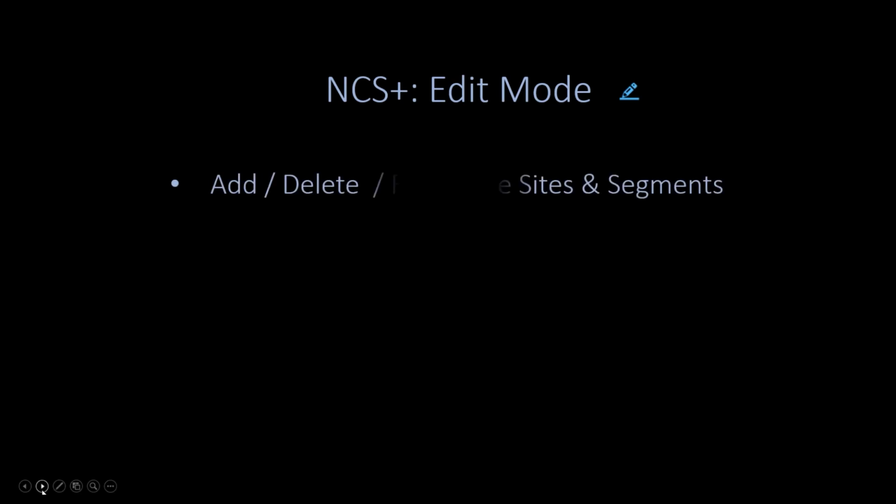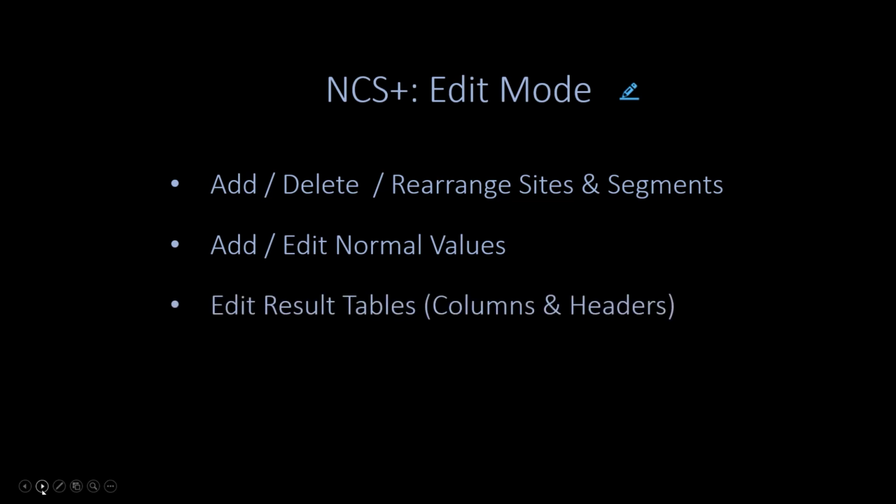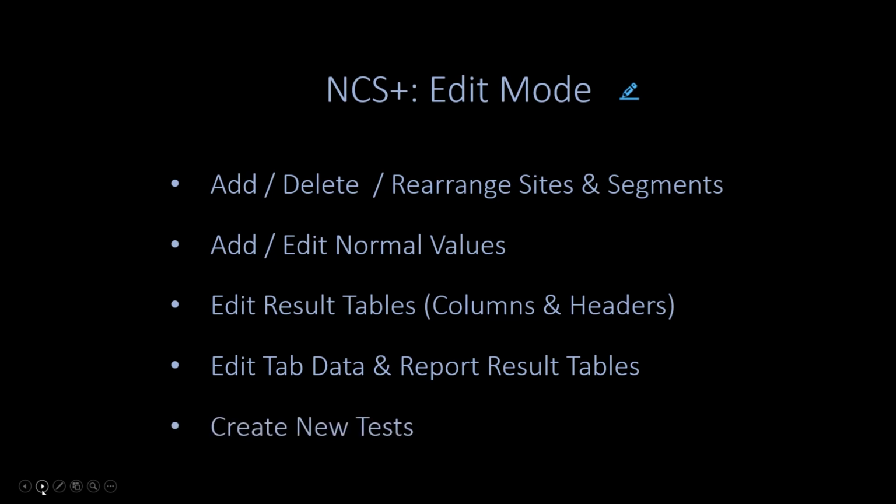Edit Mode is a new feature in NCS Plus that allows users to make many customizations directly from the exam screen. With Edit Mode, users can add, delete, or rearrange sites and segments, add or edit normal values, edit result tables, both columns and headers, and edit tab data and report result tables, and create new tests directly from the exam window.